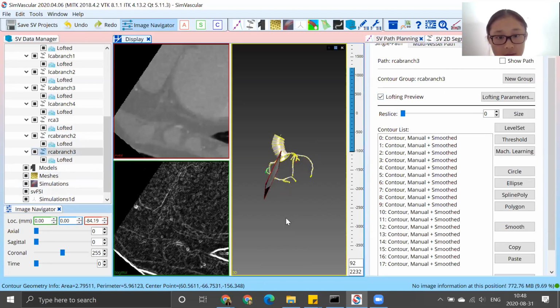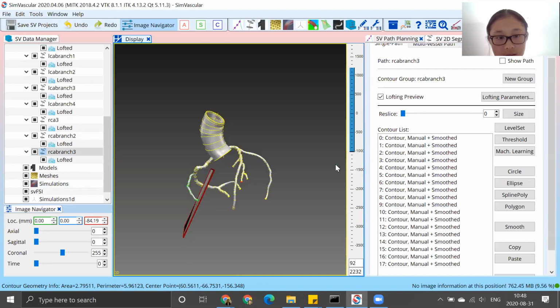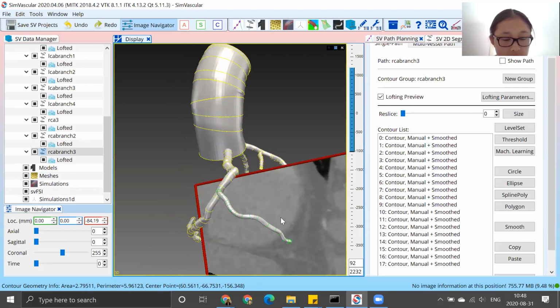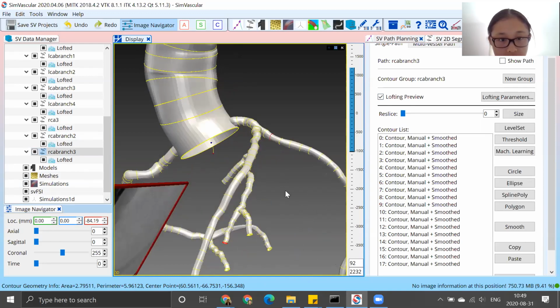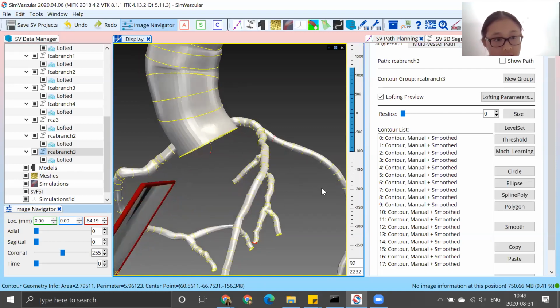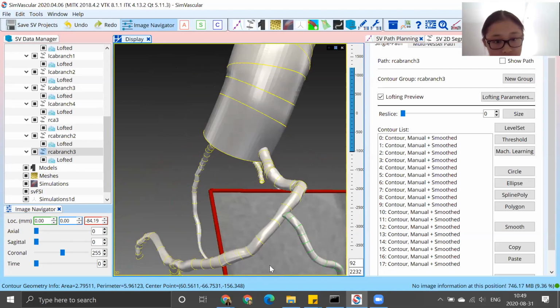All right, so we've got all of that here. And if we just make this a little bigger, yeah, we can see that all of our vessels are nice and connected. So this is what we'll want to do when we're creating the contour groups. The reason why we have contour groups going into the bigger vessels at junction points is so that the vessel surfaces would connect, as you can see here.